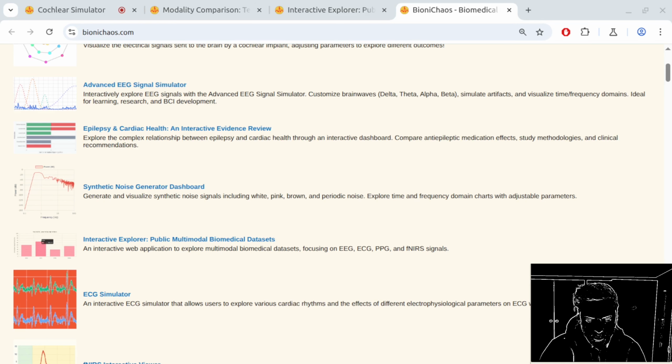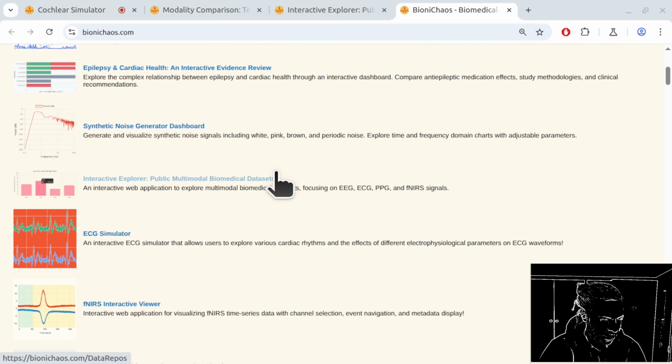Hey, we just did this right now. Can you just cut the fluff? Can you talk like a 30-year-old data scientist and suggest any other tool that we can review?